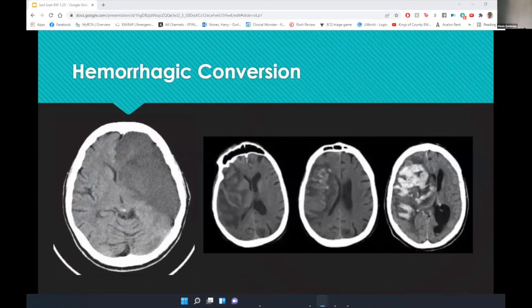So you see a completely infarcted area. It's a well-defined appearance with mass effect, like I believe Ryan was saying. Hemorrhagic conversion can happen after an ischemic stroke. In this case, the patient received a unit of fresh frozen plasma and 3 doses of vitamin K. The patient didn't really need neurosurgical intervention, was discharged with aspirin therapy, and then needed further management of paroxysmal AFib.